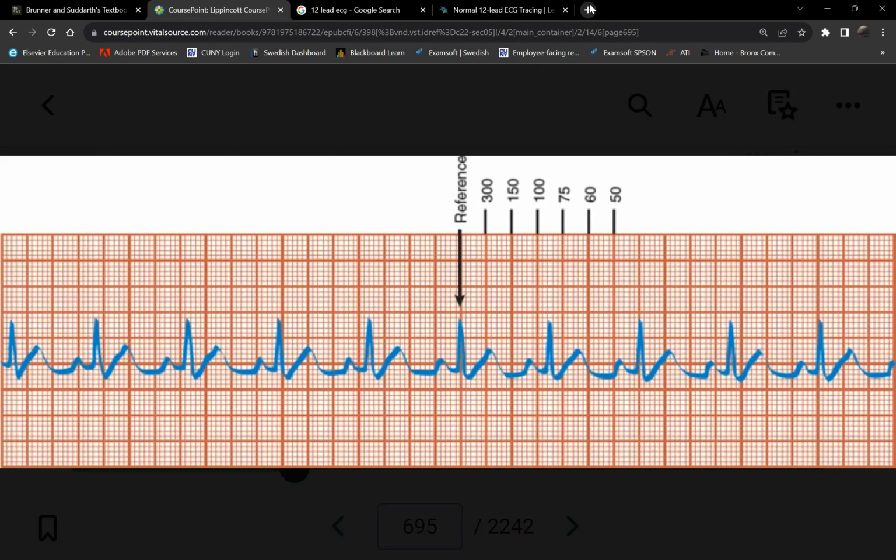So on a test question, if I give you this strip, what will be the choices you'll see, A, B, C, D? Will it be a definite rate or a range? A range. I'll give you a range. So I'll say A, 60 to 70. B, 70 to 80. C, 80 to 90. D, 90 to 100. C, 80 to 90. Got it?